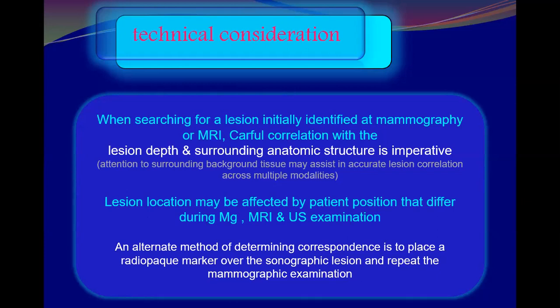So it is expected for the lesion to move some hours, or some distance, from one modality to another modality. But we have some concepts we have to consider while we are evaluating. We have to consider the depth, we have to consider the internal structure, and we have to keep in mind that we expect the lesion to move between different modalities.